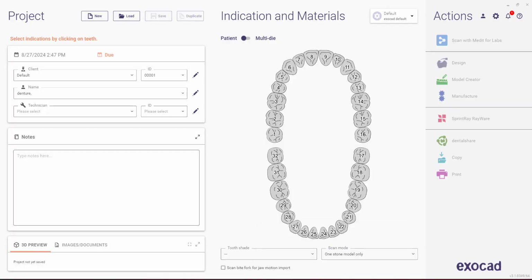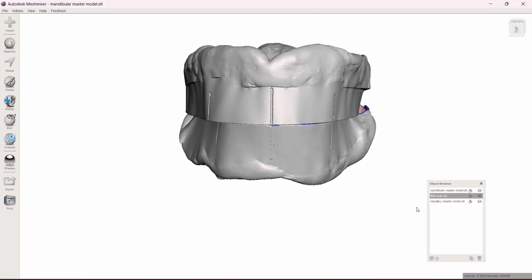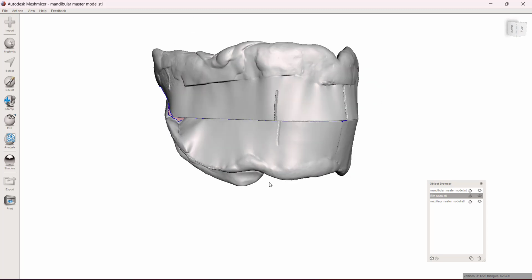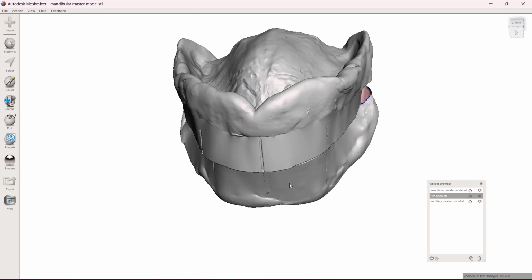Hey, what's up? This is Corey Glenn. I am going to do a video today on denture design in Exocad. So I've not seen much online as far as designing a denture in Exocad, and so I thought it'd be hopefully a useful video to make.